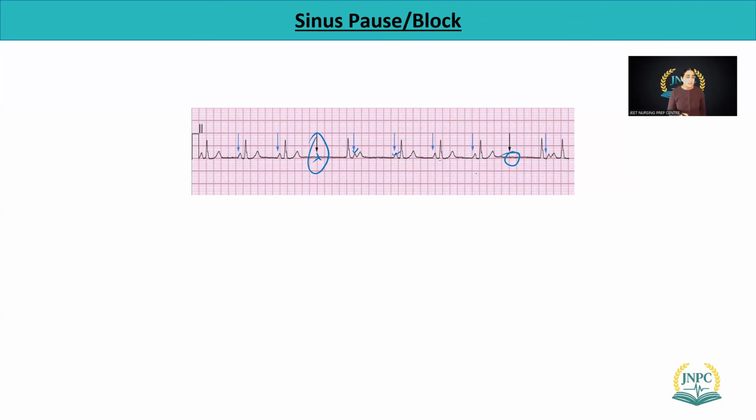And sinus block is sometimes seen when the patient is very, very sick, or maybe it's an issue in the SA node. So we call it sick sinus syndrome. Like people who sometimes miss a beat. So we call it skip a beat, miss a beat. Think about when they're missing a beat, what can happen with the cardiac output? Cardiac output becomes low.